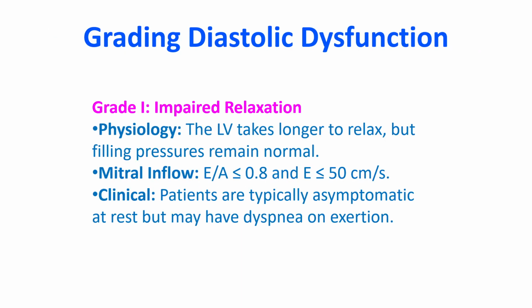Once left ventricular diastolic dysfunction is confirmed, or if the patient has a reduced left ventricular ejection fraction or structural heart disease like left ventricular hypertrophy, the focus shifts to grading the severity and estimating left ventricular filling pressures.